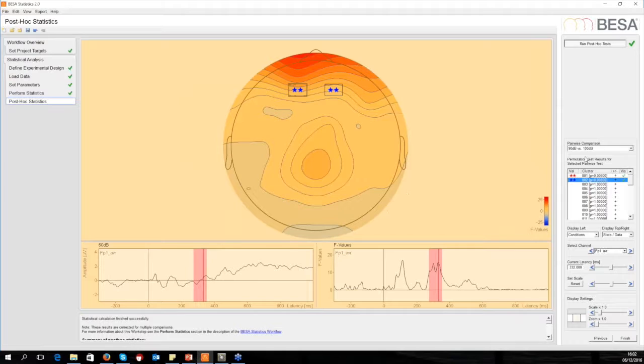Most of these clusters, if you look at it in more detail, will emerge as subclusters of the first large cluster that we found in the F-test analysis. And all the results can be exported for more quantitative analysis and reporting. There's an export menu where you can either export images in high resolution or as vector graphics, or you can export the summary or the detailed results of the cluster statistics, which also show up here in the bottom information window.